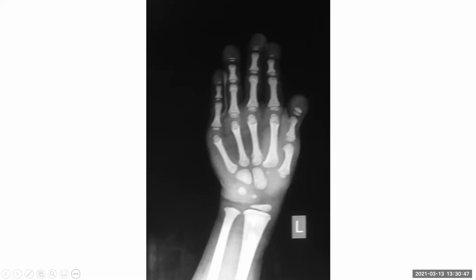Over to you. Okay. So this is a hand radiograph, frontal projection, of a skeletally immature patient. I can see there is acro-osteolysis involving the distal phalanges. Also, the bones appear dense. I cannot see any soft tissue calcifications and no evidence of fractures.